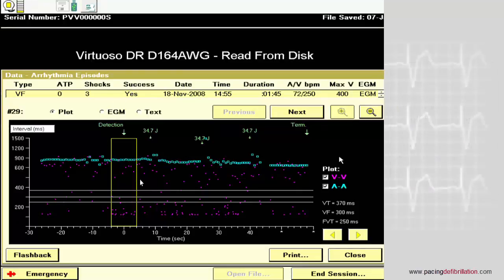The plot is really characteristic of a ventricular lead dysfunction, with highly irregular ventricular rhythm, some short cycles at the level of the blanking, and some intervals detected outside of the tachycardia zone. This is a typical aspect of a cloud of points suggesting the presence of a lead dysfunction. We can see here that for this episode, the patient has received 3 maximal shocks.